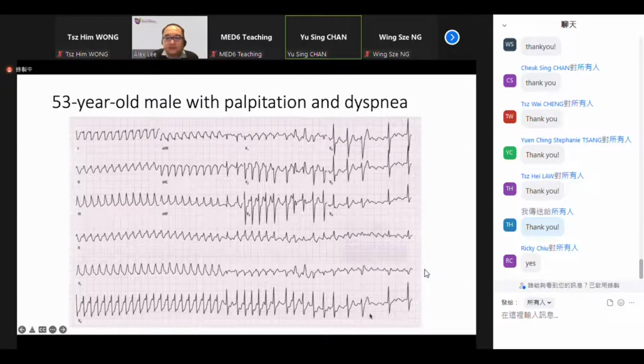This may be a supraventricular tachycardia, I think, maybe. Very good. With aberrant conduction, which spontaneously aborts later. Very good. So when the heart rate becomes lower, the refractory period of the bundle branches or of the conduction system also allows better conduction of the electricity.